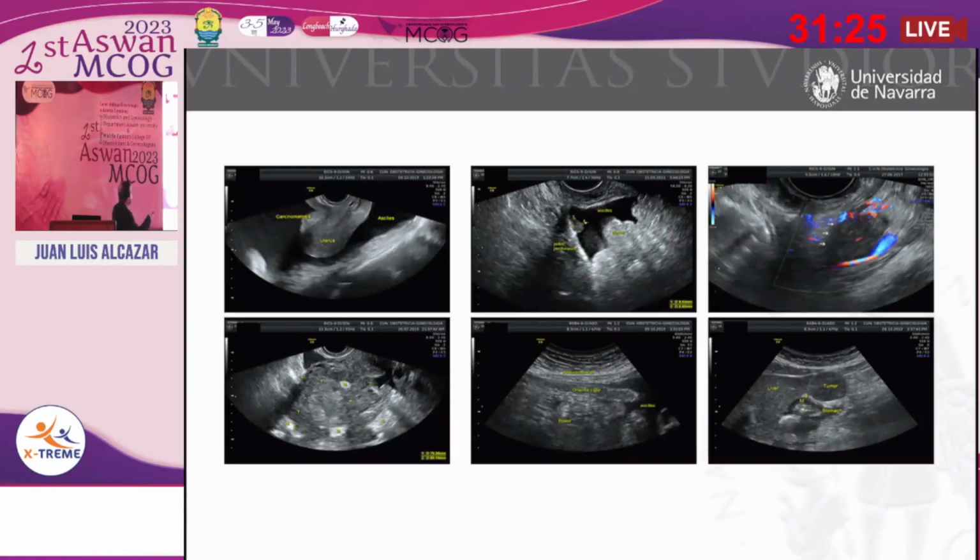Actually, this is tumor over the uterus, this is tumor on the pelvic side wall, this is a lymph node in the pelvis, this is the involvement of the rectosigmoid, this is involvement of the major omentum, this is a tumor here close to the liver.